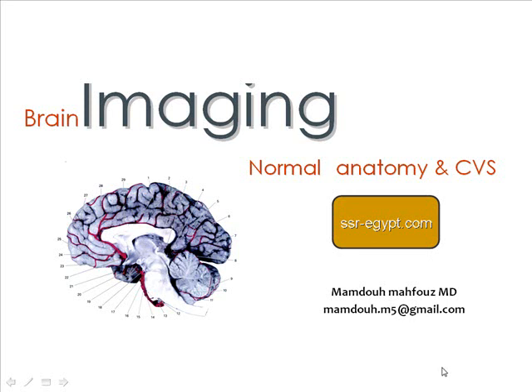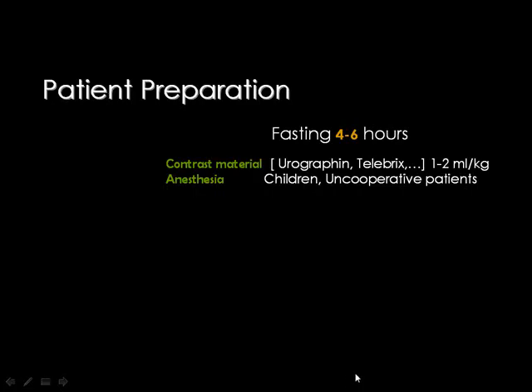This basic radiology course is to help the residents in the emergency rooms to pick up the cases and to diagnose the accurate pathology seen in the CT scans.